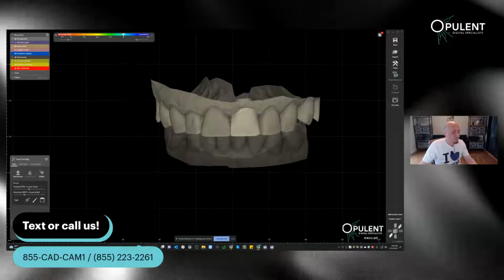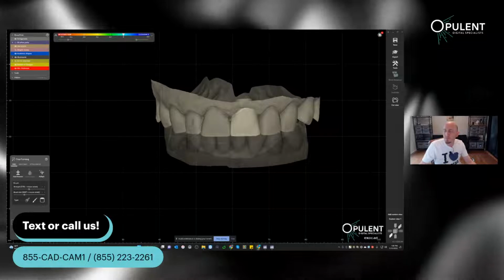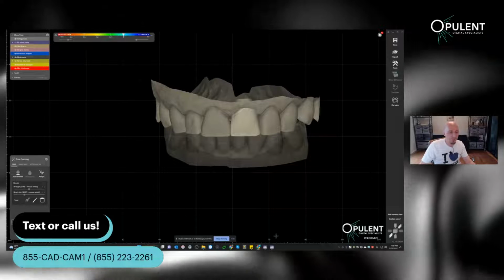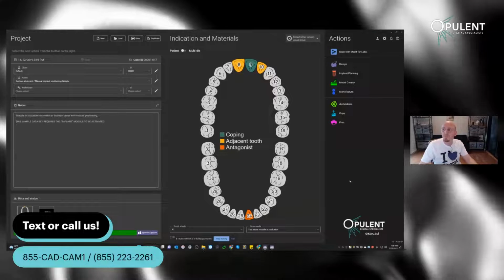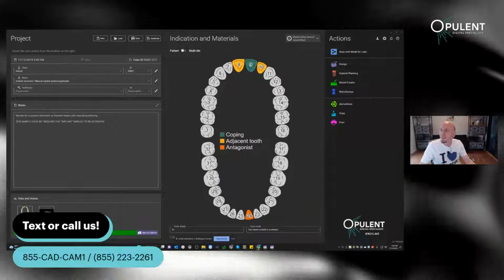So today, software, not anything else. And I will start this case over here for you. What are we looking at? I'm going to open the chat window. I think there is a message here. Yes.